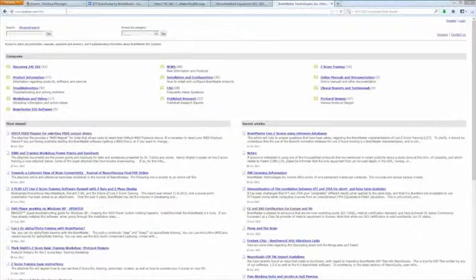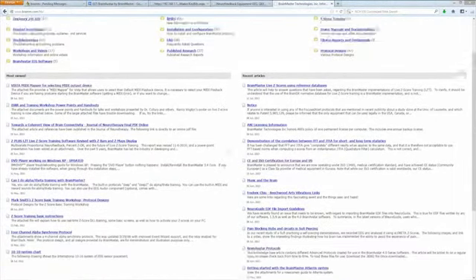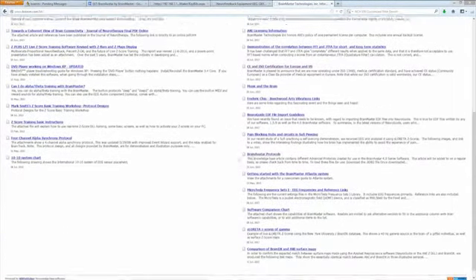To go a little bit further in this, as I said, the knowledge base is a great place. If I go to www.brainav.com/kb, and go right here to BrainAvatar Protocols, you will notice in my big old giant description of all the different things going on right here, we have a PZOK-UL with ROI-ANI 3D head map select, and we have one for BrainDX with 3D head map select.